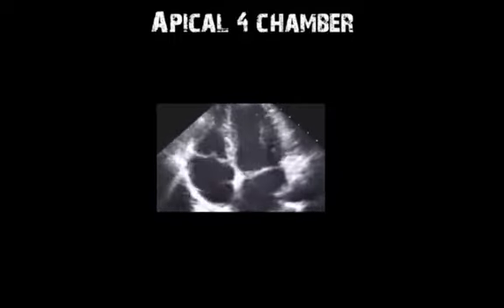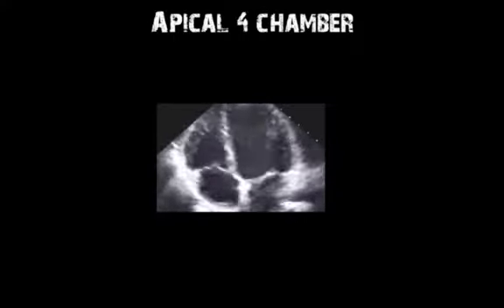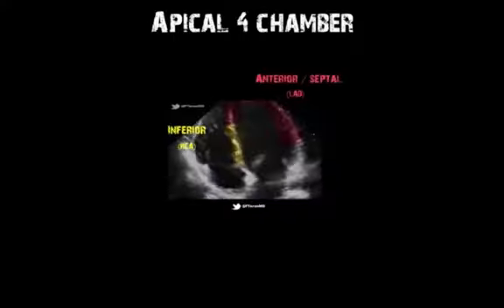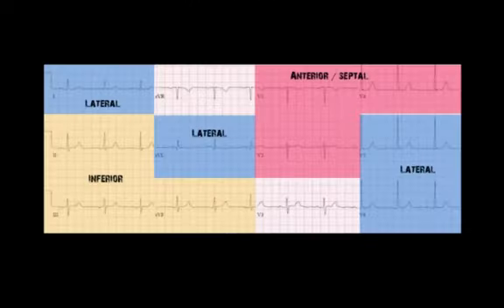Pay attention to how the septal wall and anterior left ventricular wall are contracting symmetrically, coming together during systole. Here, one more time, the same clip with coloring to help us memorize the anatomy and the regionalization for the assessment of wall motion abnormalities. Now this EKG highlights exactly which leads correspond to which regions of the heart.